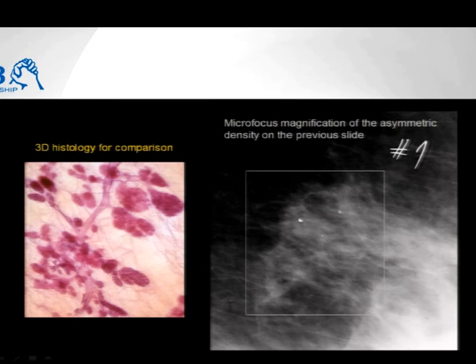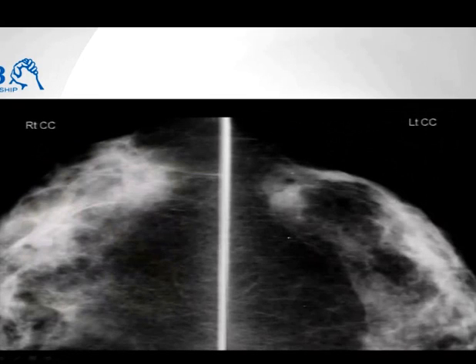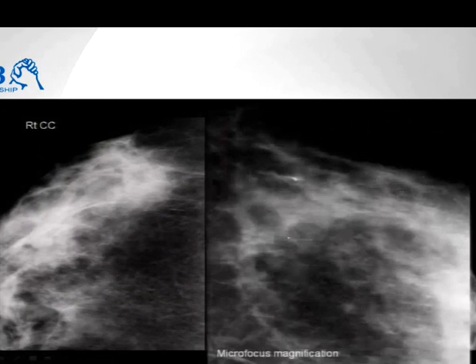And do I see fibrosis? Yes, it's here. Very thin, fortunately. Do I see a duct? Yes. Do I see fat? Actually, I see 4 out of 4. And it's a large density. It's a normal fibroglandular tissue. And before I sign out a well letter, then we have this picture as well.